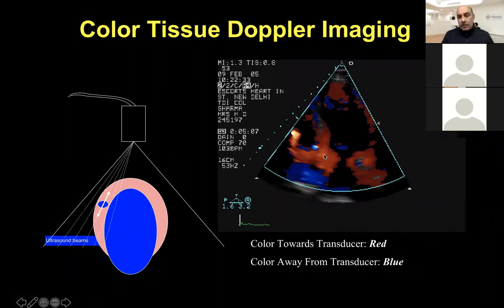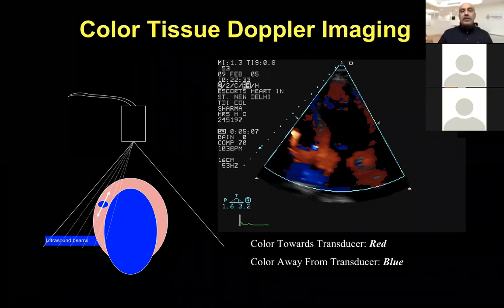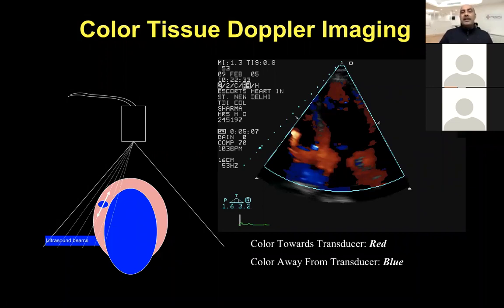In this particular patient, there's red, and also you can see the amount of magnitude shift is quoted like this. So this could again give you a practical, important dimension of cardiac contractility as well as diastolic function.